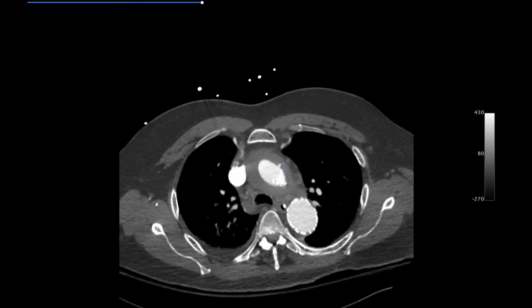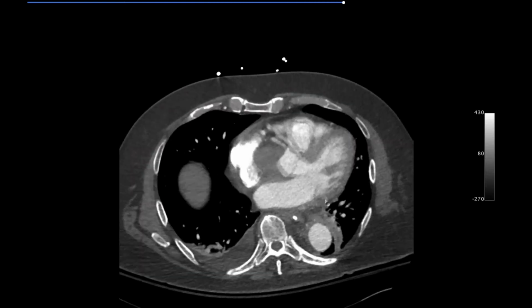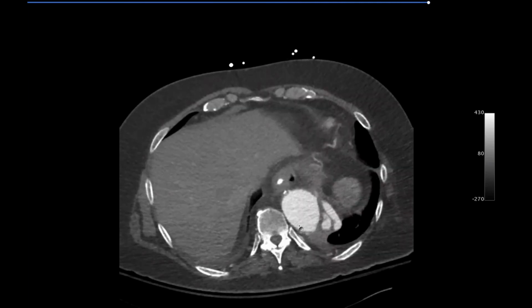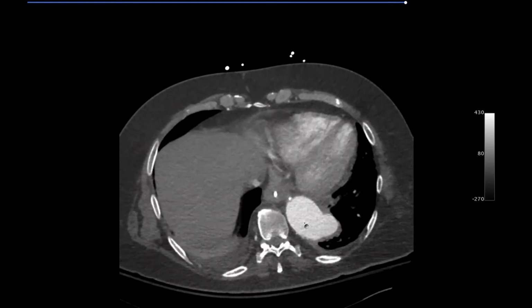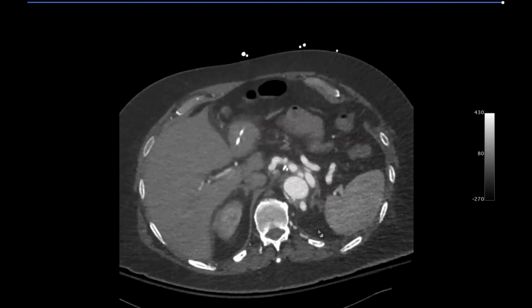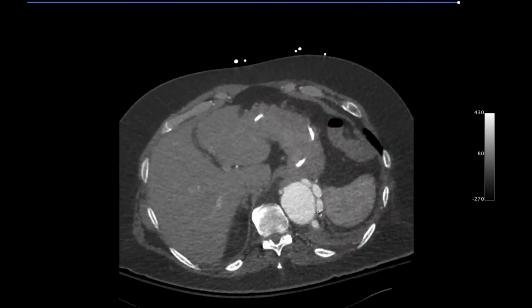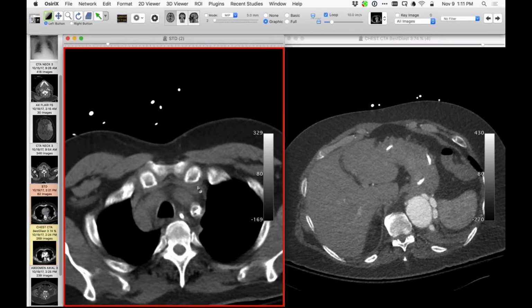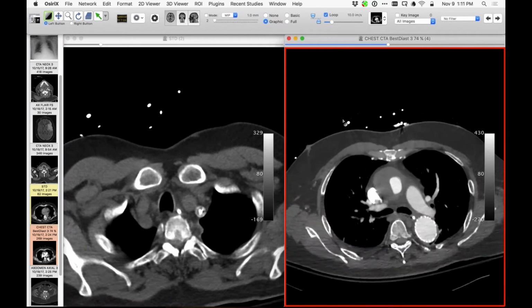And then this finding right there, which is really interesting too. And then I'll just show you really fast here. When I first saw this, I didn't know what was going on. And it turned out that he had a Carrel, C-A-R-R-E-L type patch for the second operation, connecting this portion of the aorta to a whole bunch of visceral arteries like the celiac and a bunch of others from that previous operation. Has anyone seen an IMH so extensively involve the innominate artery and other vessels from the aorta, or to the extent that we see here too? Not to that extent.